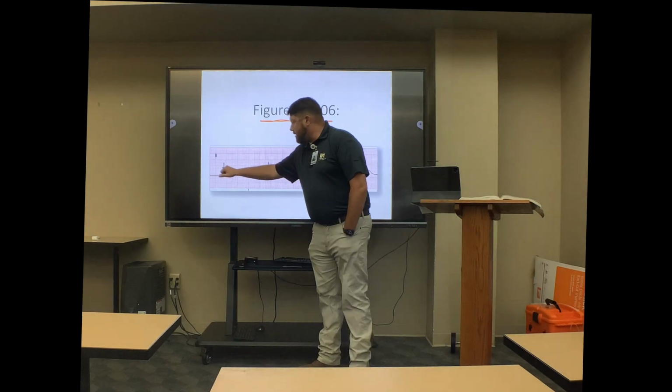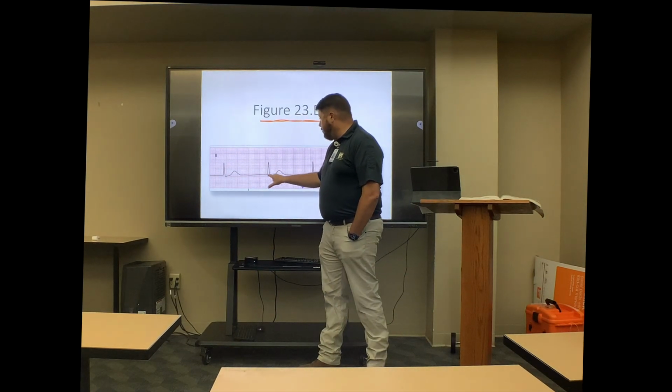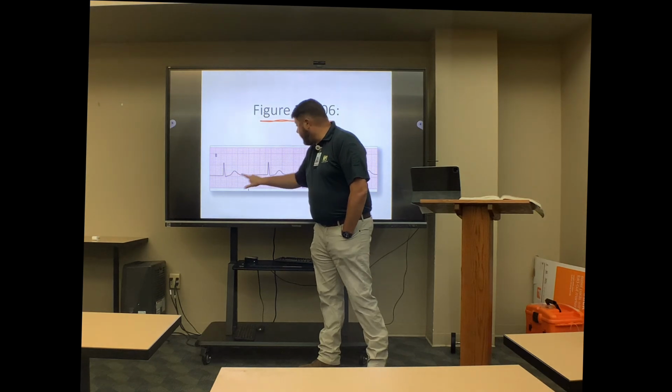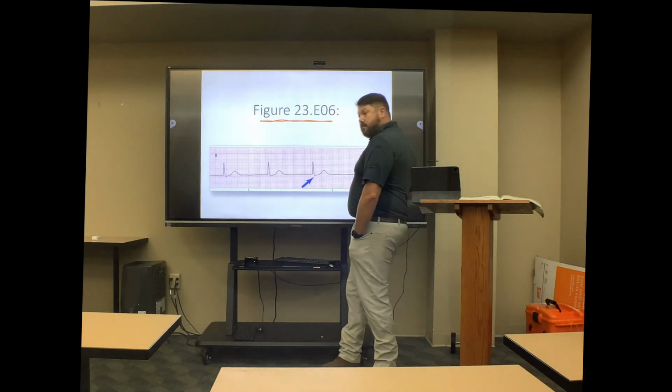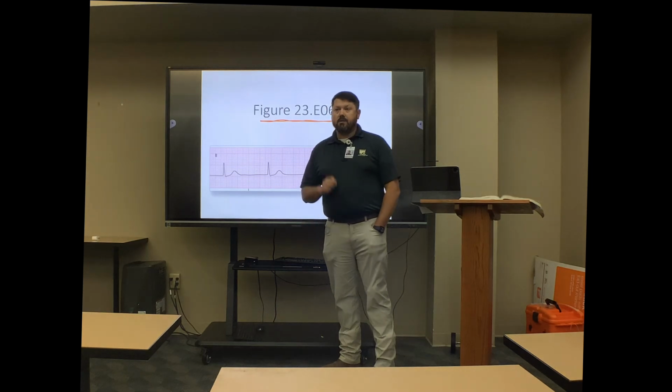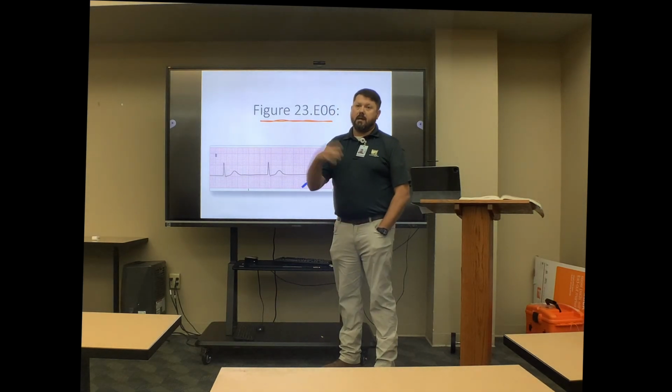You've got QRSs that are the same. You have no preceding P wave, inverted, positive, whatever. There's nothing there, right? You got T waves that are well defined, that look good, right? Then you got this little bump right there that shouldn't be there. So that is your inverted P wave. Okay? You good?